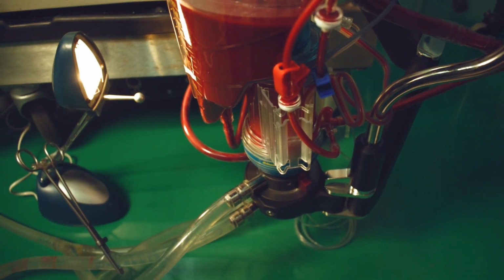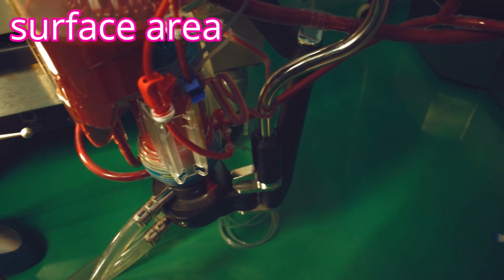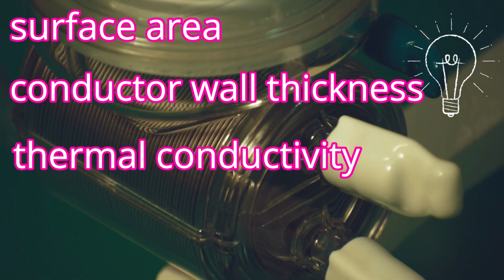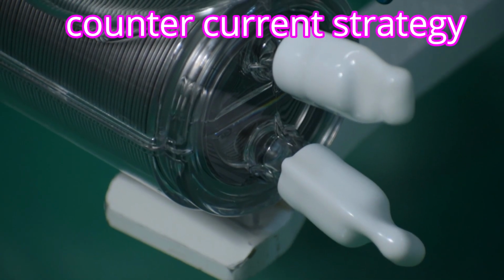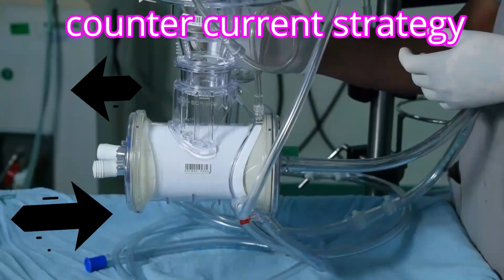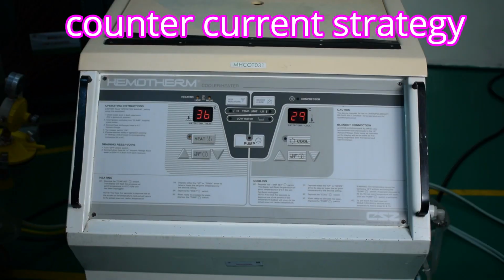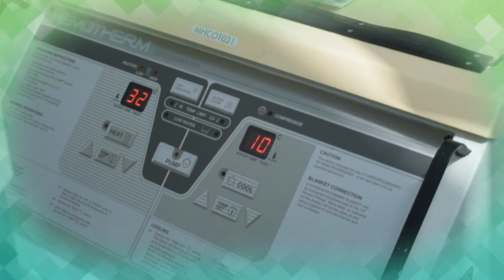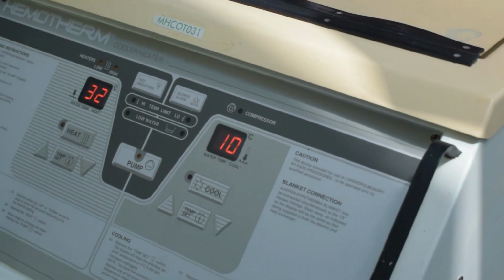Now, the effectiveness of a heat exchanger depends on several factors, including the total surface area, thickness of the conductor walls, thermal conductivity, and the residence time of blood through the device. Heat exchanger basic design consists of two phases, with water passing on one side and blood or perfusate on the other side. So the direction of blood flow is routinely countercurrent to the flow of water, which optimizes heat transfer. The temperature of water entering the heat exchanger is controlled by an external cooler or heater device, as said before.